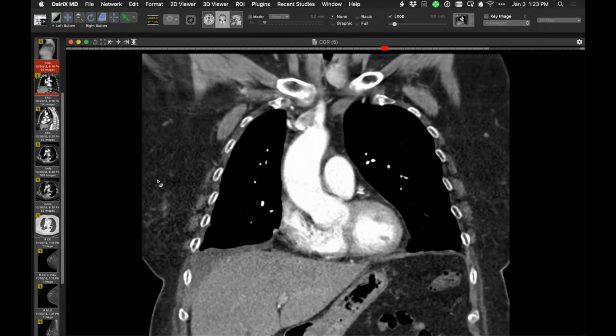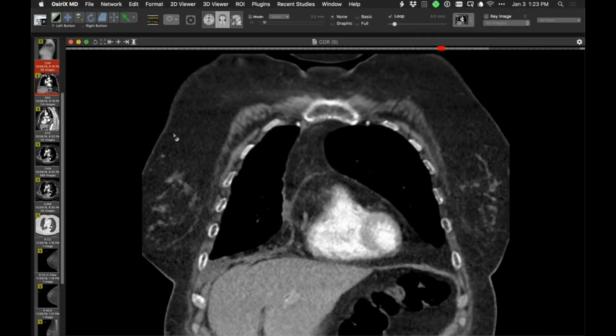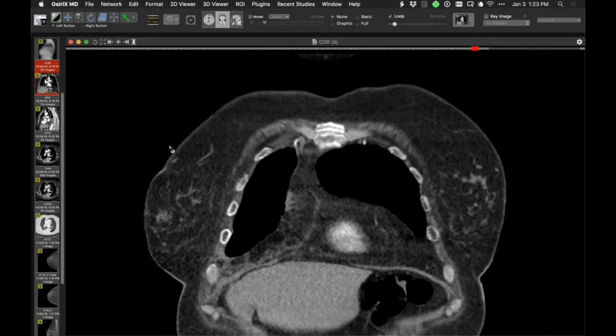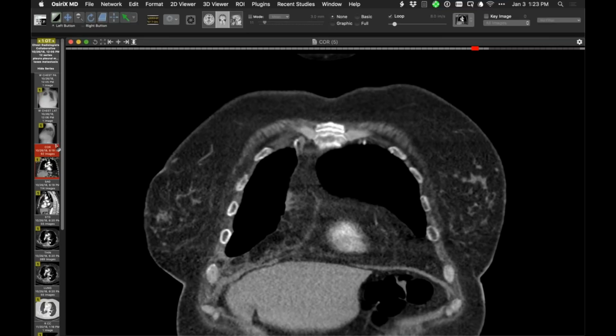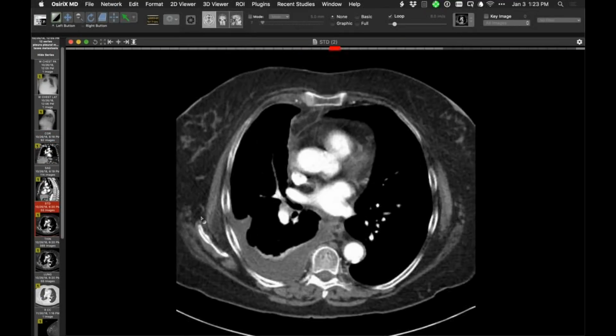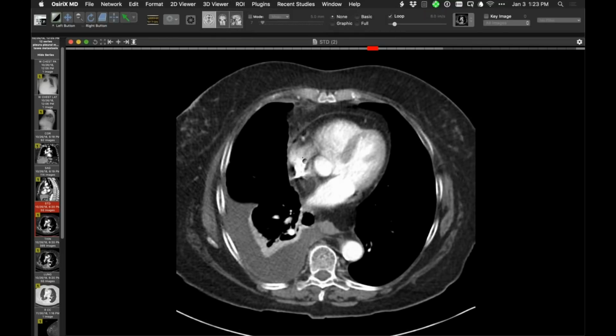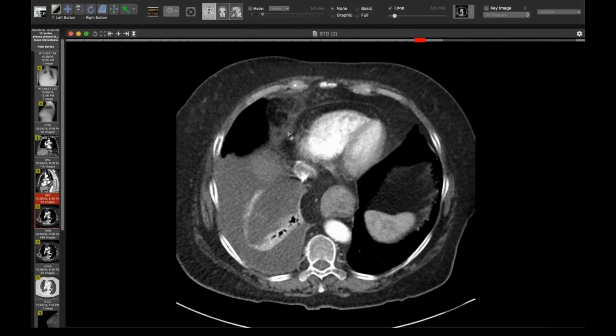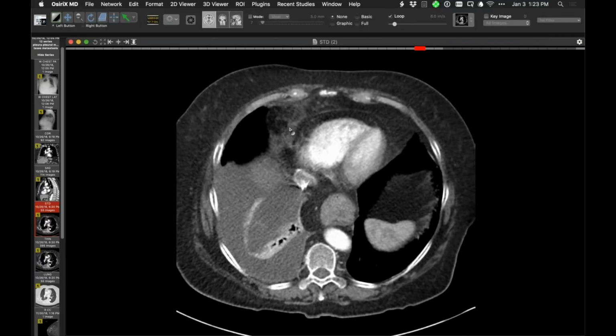Another thing that's good for meso is invasion of that anterior mediastinal fat from the pleural surface. So I think on the first case you showed in this series, there was actually some tumor nodules in that anterior fat near the apex of the heart. That I think is more common with mesothelioma than it is with metastatic cancer. Oh, I see in that first case. Yeah. Yeah, the more one looks, the more you can see pathology here.